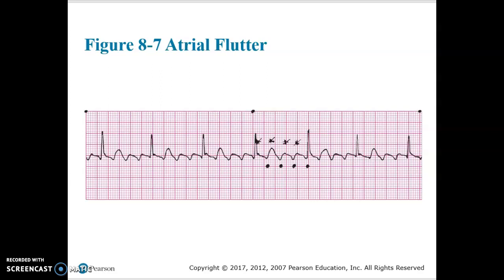So the very first question that we're going to ask ourselves: do we have QRS complexes? And the answer here is yes, we do have QRS complexes. If we count the width, they're normal and they're shaped the same. Then we're going to count the little blocks between the R and the R, between this R and this R, and write the number down up top. Or we can take a scratch piece of paper, put a mark on it, and trace it out. But we're going to see that this is a regular rhythm, okay? So we're looking for regularity. It is a regular rhythm.